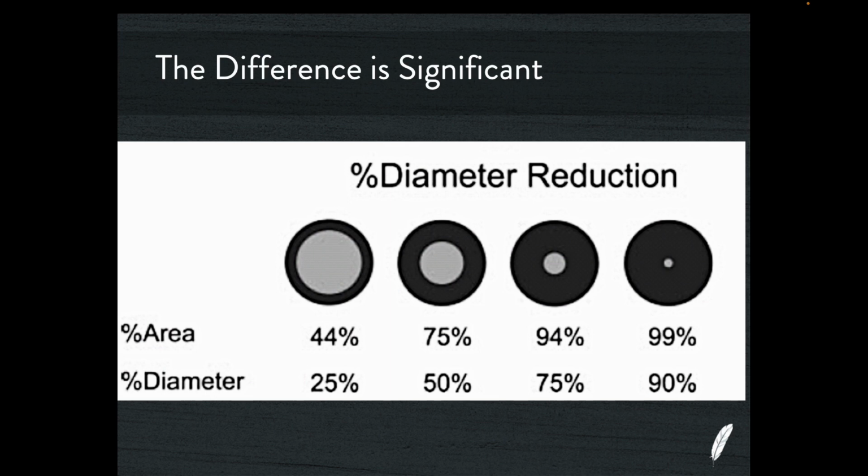very different things. So if we're going to play this game of putting an ellipse around the vessel, around the ICA or the bulb, wherever the plaque is, the outside lumen, and then put another ellipse or a spline trace around the patent lumen, and then work out the difference between this area and this area, this is going to give us an area reduction. So if we did that trick where we put calipers around the outside and then calipers around the patent lumen, it might give us a 75% area reduction.